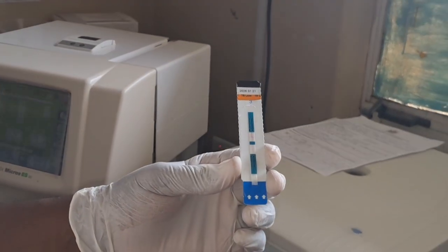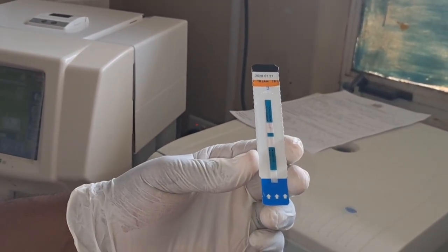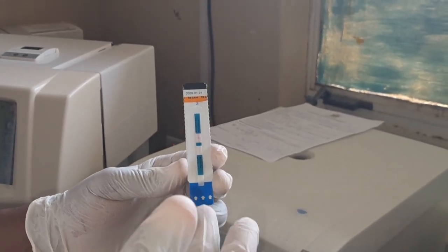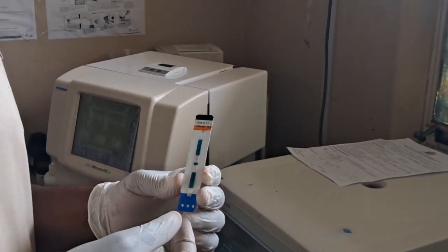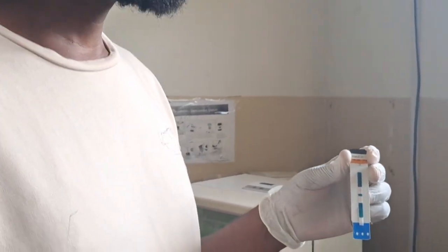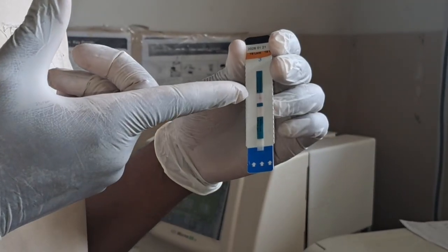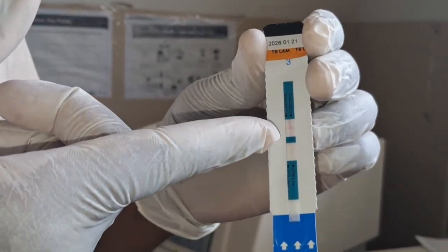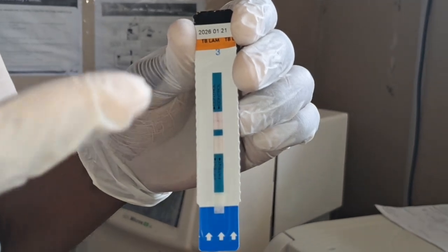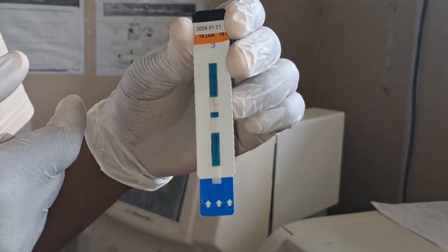Quality control is one of the things we focus on more in the lab. It validates the testing procedure or an RDT. These RDTs come with an inbuilt control line. This is the control line; you find it here on top when you're looking from the arrows. This is the control, and this is where the test is supposed to be found.